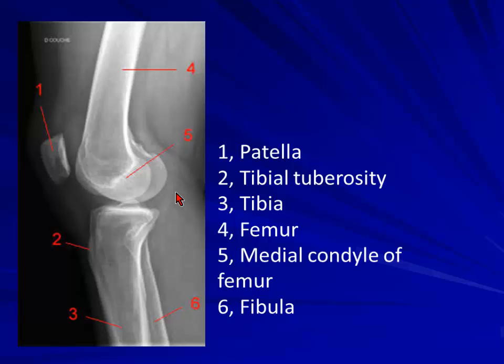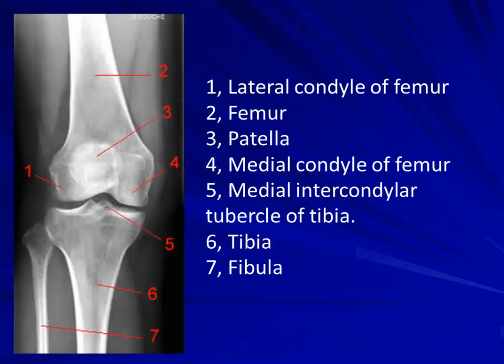So there is nothing different, similar. Again, if you look at the joint here, as we talked about the joints, you've got two articular cartilages from one bone to the other bone. So you look at the cortex and look at the regularity and homogeneity. So basically, if you see a disruption in either side, then probably you are thinking of either degeneration or osteochondral defect, or it can be a fracture.